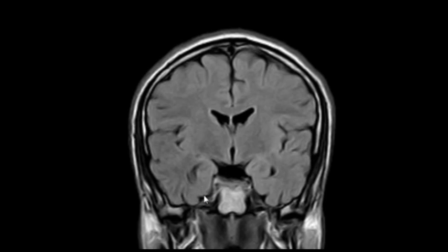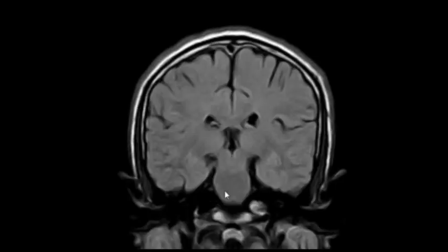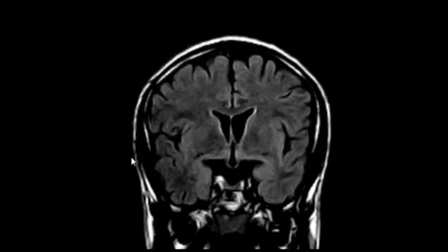The atrophy of the hippocampal area with prominence of the temporal horn of the lateral ventricle, and high signal area, increased T2 signal intensity. Exactly. Good. Do we have these features? Not apparently. I think the right side. The first thing you said was an increased T2 signal intensity. You saw it on the T2? Yeah, because it's increased signal, but you need to make a little bit harder window. And now, is it apparent or not?